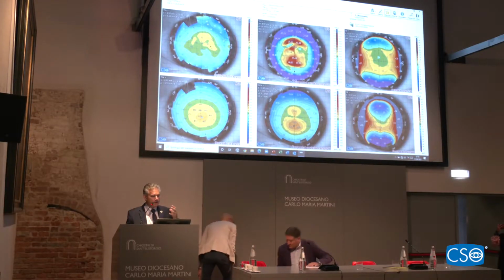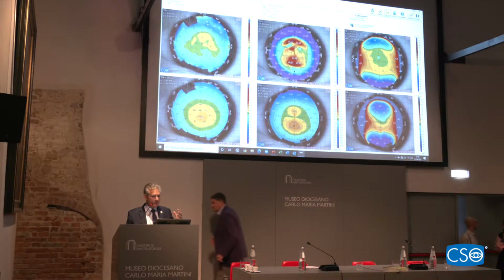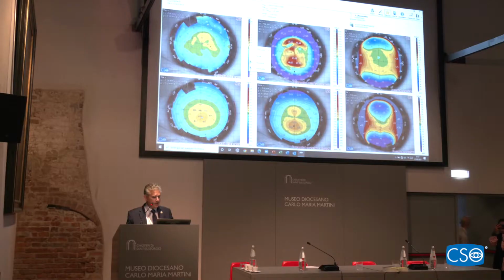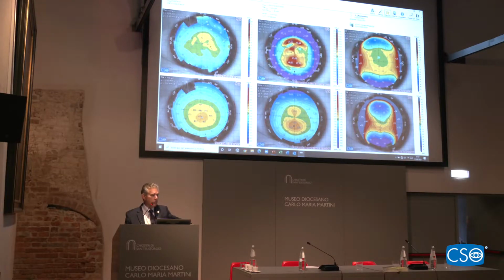And now we look at this map first, the 6 map, and also I want to point out that we use the American style scale, and we also have all of these overlays put on, all of them, because it gives us the ability to look in Cartesian coordinates or polar coordinates for locations of pathology.